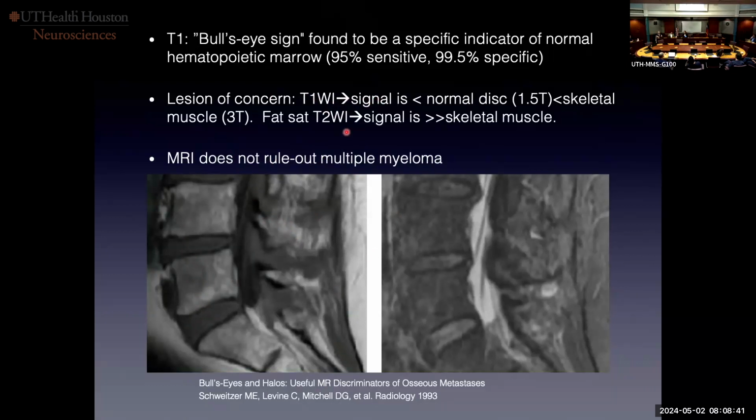That is concerning. You can see that this patchy area has the bullseye sign, and this is some artifact coming up from pulsation of the bowel. Overall, the lesion is certainly not super bright, so these are not lesions of concern. This is probably just patchy hematopoietic marrow. It hasn't converted completely to fatty marrow.